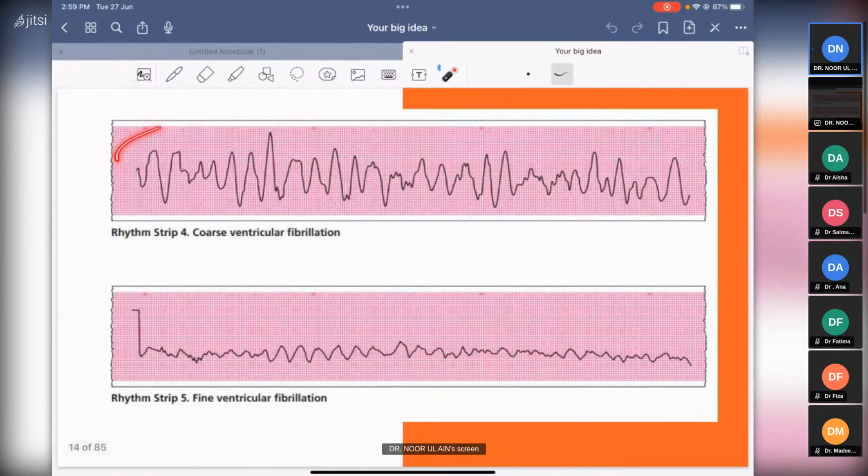This is ventricular fibrillation. The patient will not be awake. The patient will have no pulse. You have to go and treat the patient as soon as you can. It's a medical emergency. Your most important abnormal rhythm. It is very important to address this. Now, there are certain specific details about ventricular fibrillation, and there are so many things that I can talk to you about it. I won't really go into details, but I am just telling you.